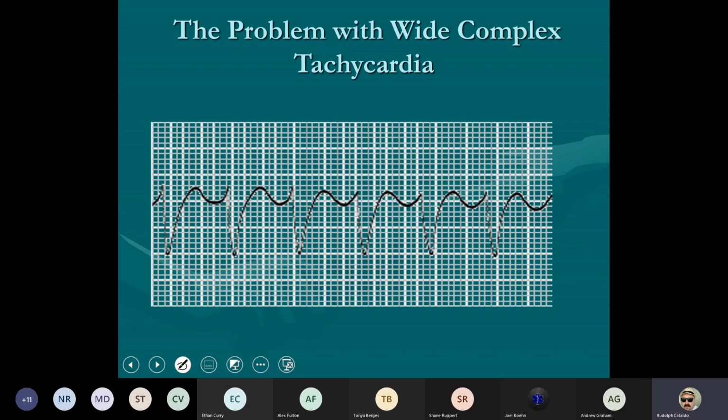We actually already went through a VTAC. Does everybody see? Would everybody still consider that VTAC?